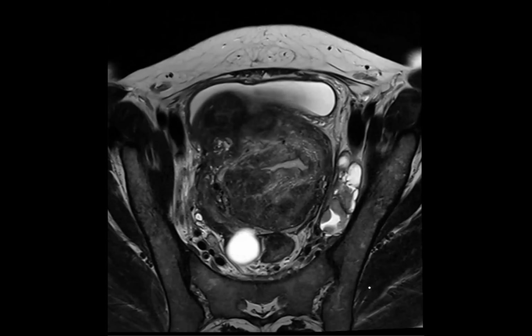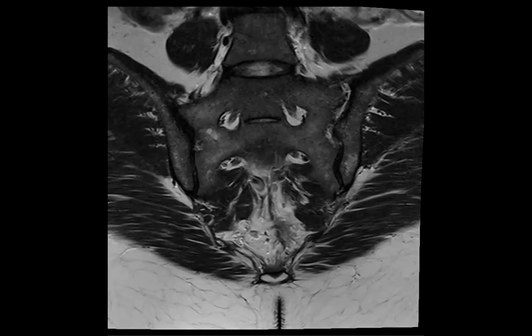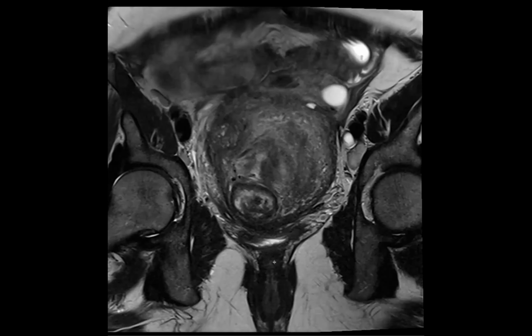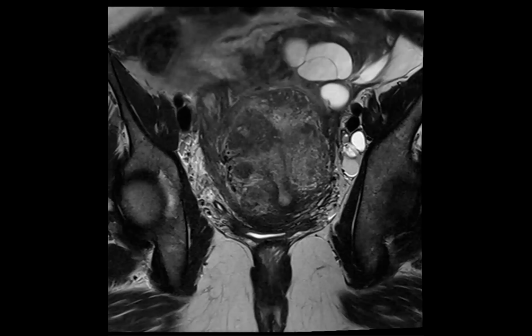Can I interject as well? Yeah, of course. We had a similar situation recently: a young lady with an endometrioma and an enhancing nodule. Same thing, went to surgery, came back as polypoid endometriosis. I've tried looking up literature to see whether there are any distinct imaging markers where we can say this is benign and this is malignancy, but I haven't found that answer yet.